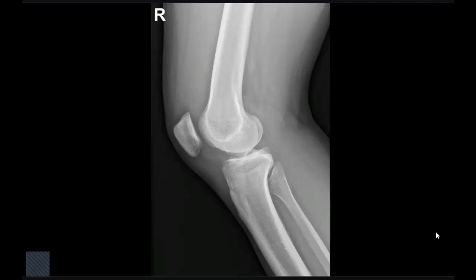I will check the cortices of the femur, patella, tibia, and fibula. I can't see an obvious fracture. However, I can see a deep sulcus sign within the lateral femoral condyle. This sign is indicative of ACL tear.